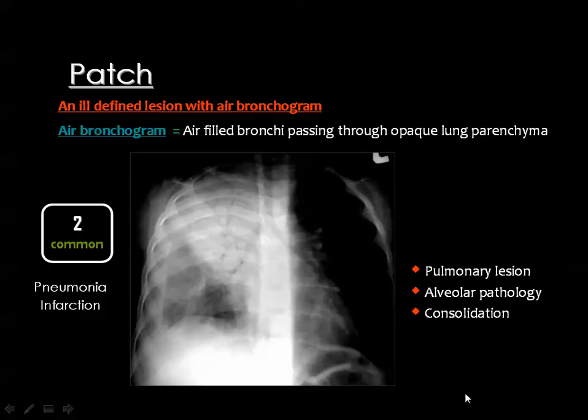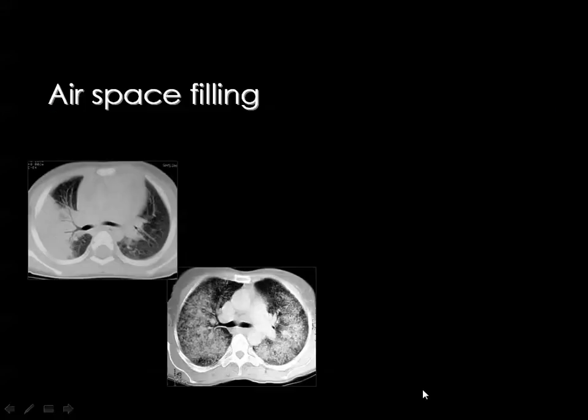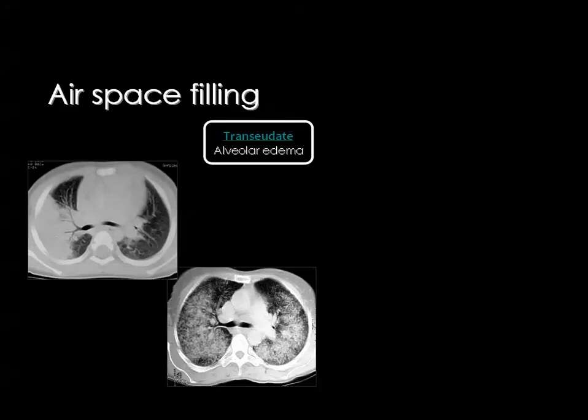And you can easily identify the source of emboli in the leg of the patient, for example. Then you remember that an opacity with air bronchogram means consolidation, and pneumonia is one of the causes of consolidation in the lung. There are 5 causes. It depends on the material replacing air inside the alveoli. Actually, if you remove air and you put fluids, then you are diagnosing alveolar edema.